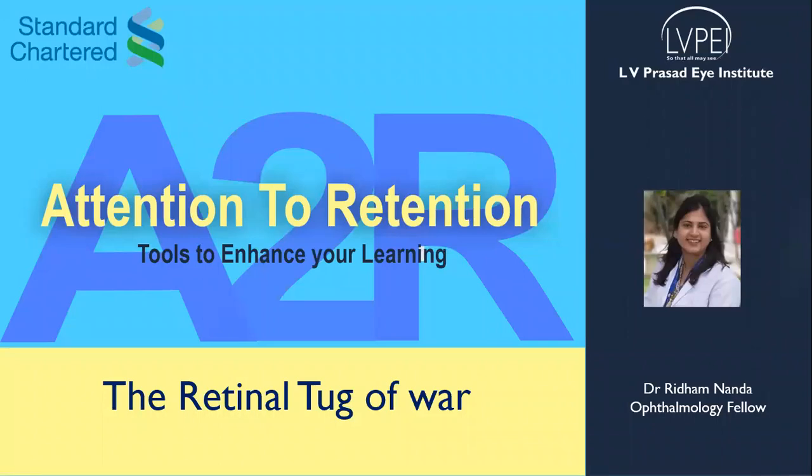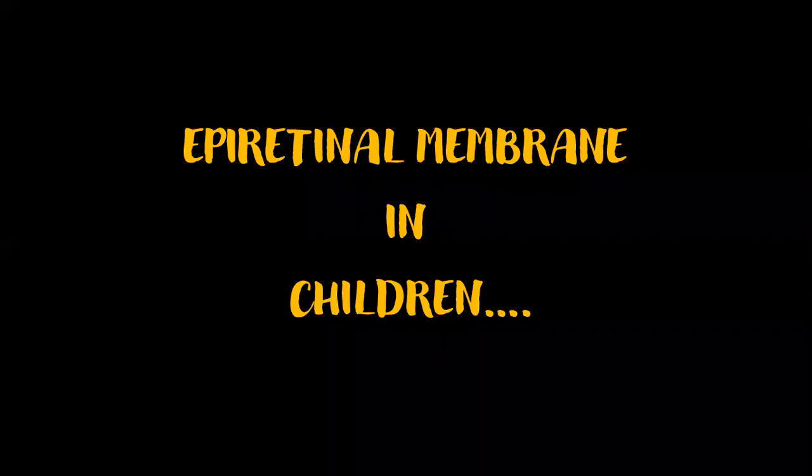Hello everyone, welcome to this another episode of iCast on the retinal tug of war. Over the next few minutes, we will be discussing an interesting case of epiretinal membrane giving an appearance of tug of war inside the eye.